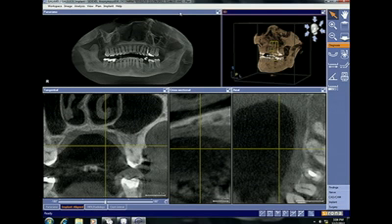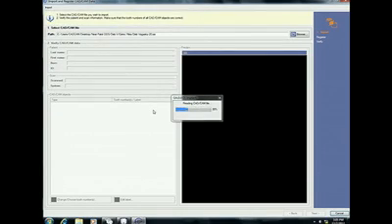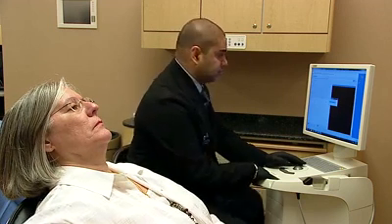So what I'm going to be doing first, if you remember the protocol that I follow in my practice, is to always start with the tooth first. So importation of the CEREC restoration within the software is fantastic, and it's easy. There's a CAD/CAM tab here on the lower right-hand side. When we click on the CAD/CAM tab, you can open a file, and you want to browse for the file that's appropriate. We exported this at an earlier stage, if you recall. And so we're simply opening up that CEREC CAD/CAM file, Deb, as you can see here.